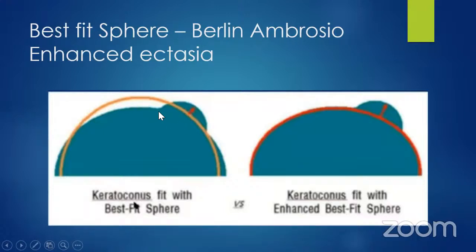So what it does is exclude the central 3 to 4 millimeters of the cornea, which could have the ectasia, and takes a best fit sphere. Then when that best fit sphere is taken, this particular ectasia gets very much enhanced. So it is excluding that one odd area, basically the outlier, and then you put a best fit sphere so that the one value which is outlying will be very much prominent.